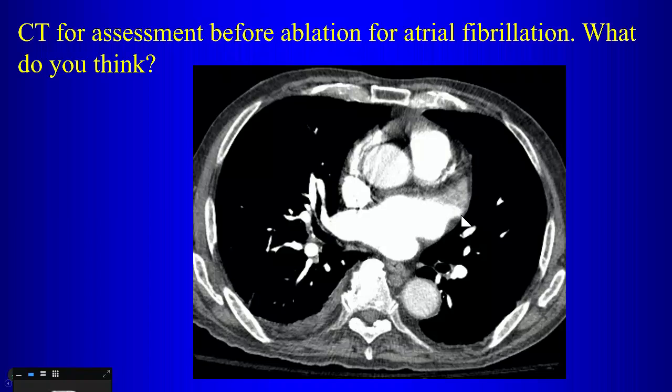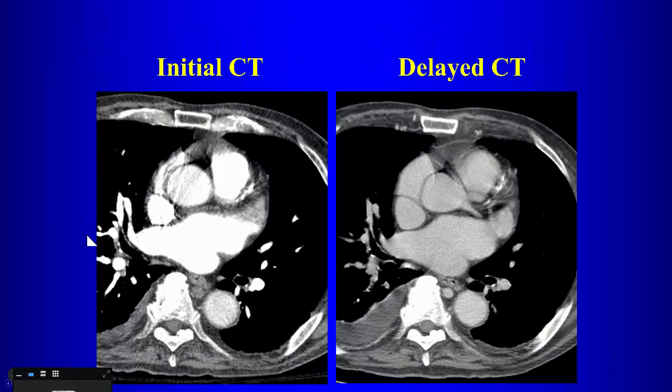So what can you do? Echo? What are you saying? Delay. Not echo, no. What they have to do is a transesophageal echo, which they could do, that's rather invasive, but an easier method is what? Delay, yeah, so we did get a delayed CT scan. Right. So just a minute after you injected the contrast, that then allows enough time for the contrast to mix in, and then the filling defect goes away. So this is part of the protocol. So part of our protocol is to include a delayed set of images for this reason.